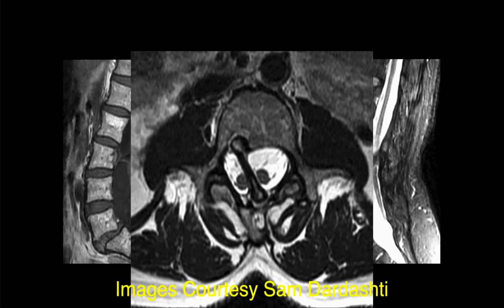So it can be fibrous, or you can just have nothing in between the two, just a separated cord. But often it's fibrous. And it can be bony, as we talked about yesterday. And this is a bone stuck in between the two, a chicken bone.